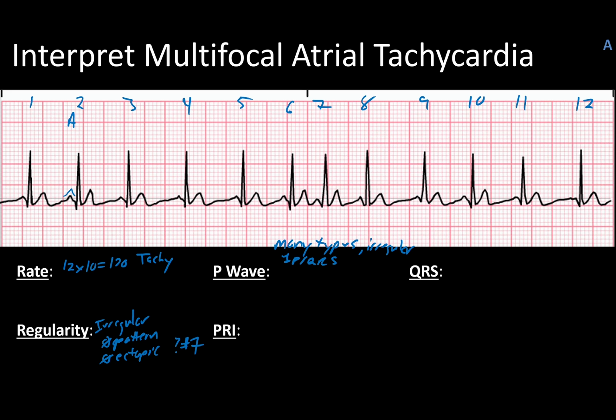And who's got the next most similar? I think number 6 has a pretty sharp point to it. You could maybe argue number 8, but it's a different shape. Number 10, though, I feel like has a very similar shape to it. Now, if we look at beat number 1, that's got a bit of a peak to it, but it's more rounded by comparison, so we'll call that one B. Actually, number 3 matches that pretty well. Number 5 does a really good job, and we'll go 9 and 11 as well. I think all pretty well match that, just in the way they look.